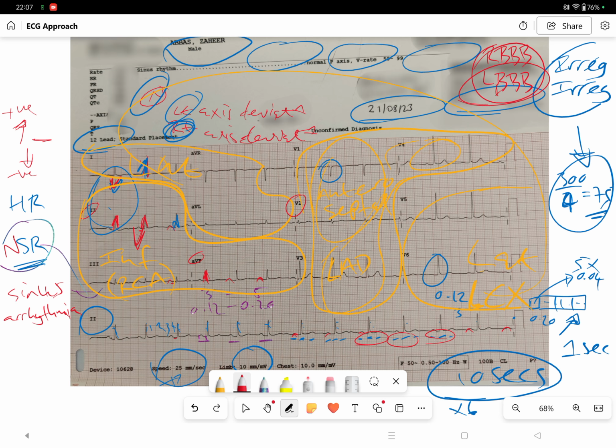Now, just before I conclude, it's always worth noting that, if you did notice, the T waves in my lead aVR here and V1 here are actually inverted. And this is an absolutely normal, common exception to the rule that T wave inversion is a result of ischemia.